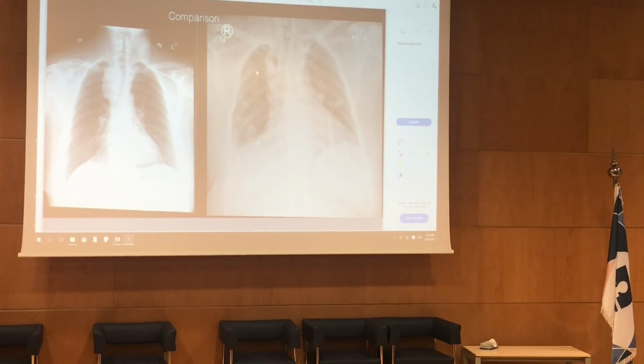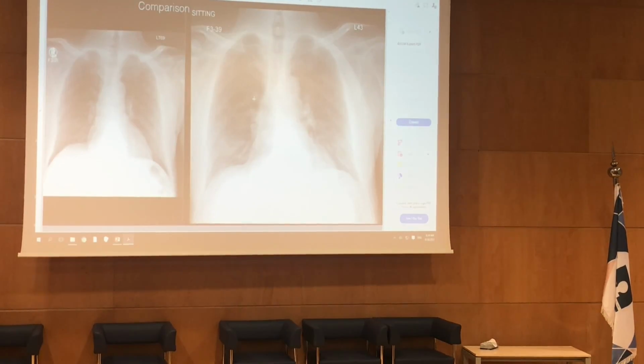So anything I see here, a bit of pneumothorax, and this is a thoracotomy tube, and just some edema following the surgery. When I look at this patient, I would know that this patient is getting worse. I'm seeing an increased density or opacity here in the middle lobe of the right lung that was hardly seen on this X-ray. So I can tell the clinician, or I can tell myself if I'm the clinician, this patient is getting worse.